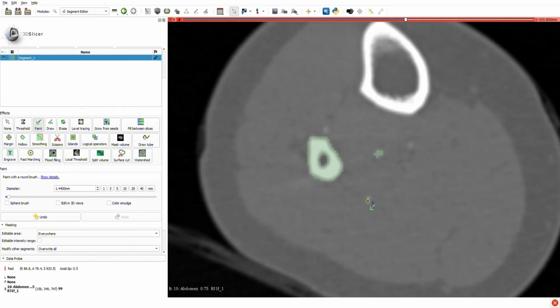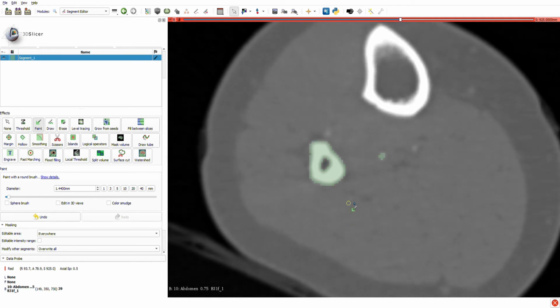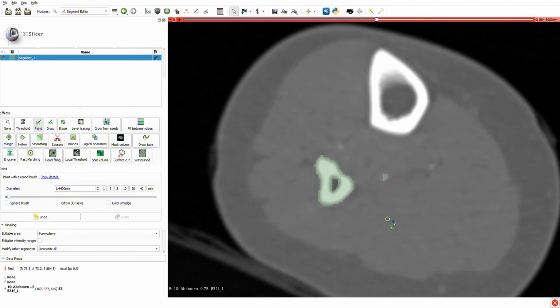I can see like this. You don't have to be very exact and correct, because this is needed only for the decision where the graft will be taken, at which segment of the fibula. Usually it is above the distal 6 centimeters from the distal malleolus. This is enough. This one looks like a good perforator.